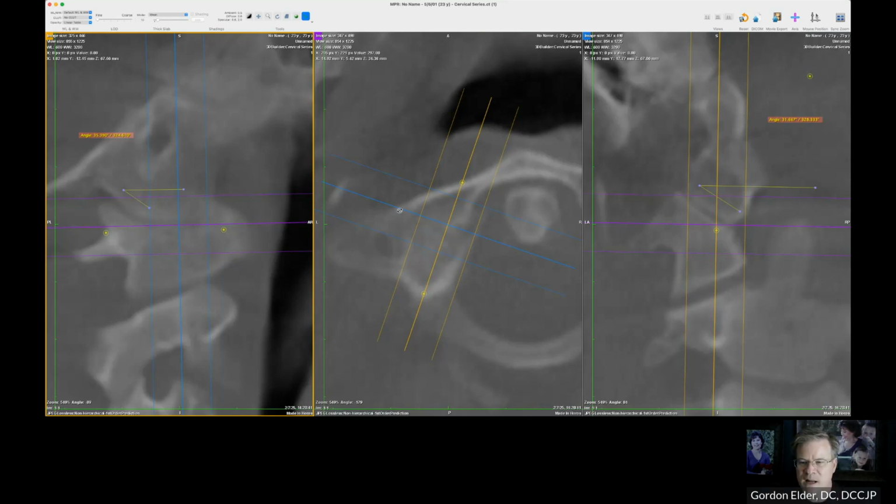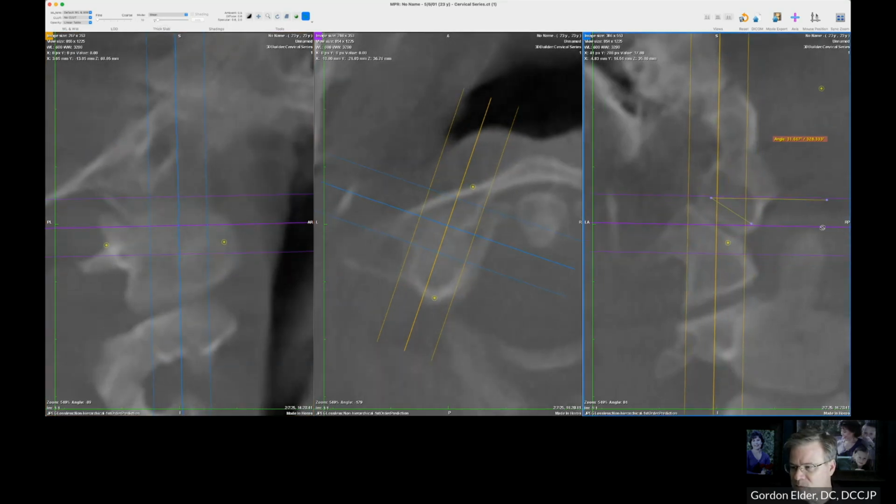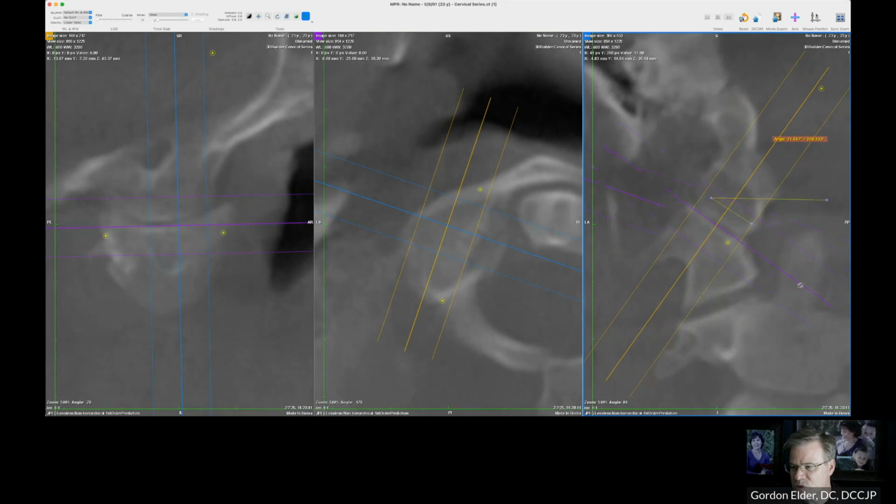Now I want to analyze this, and now I can start moving things around without worrying about the fact that I'm leaving my reference points, my reference planes. So I want to see this really clearly. So what I'm going to do is move it up here. And a lot of times I'm looking at these actually at 5 millimeters. We're still at 10. Ideally, we should be looking at these at 20, but we do start to lose some definition.